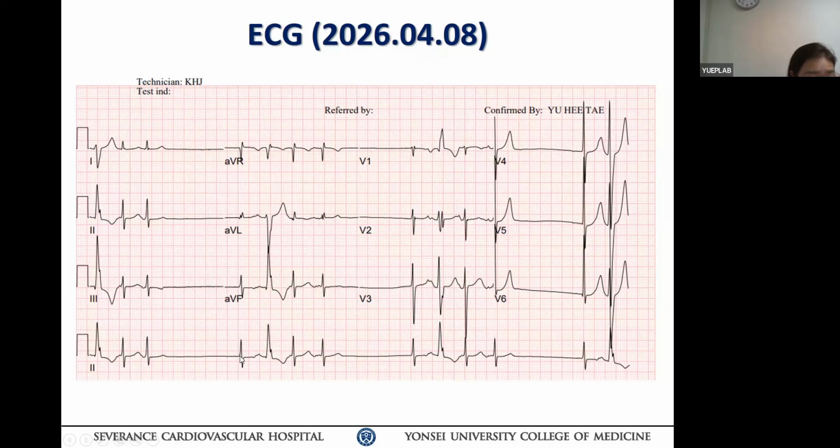I don't know if it is a sinus P wave or ectopic P wave or non-sustained atrial tachycardia. Anyway, three consecutive beats are preceded by P waves. And then why the second beat is changed to be wide QRS, and what she mentioned about the Ashman phenomenon.